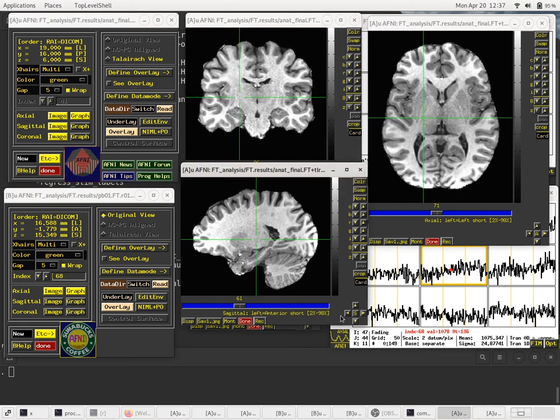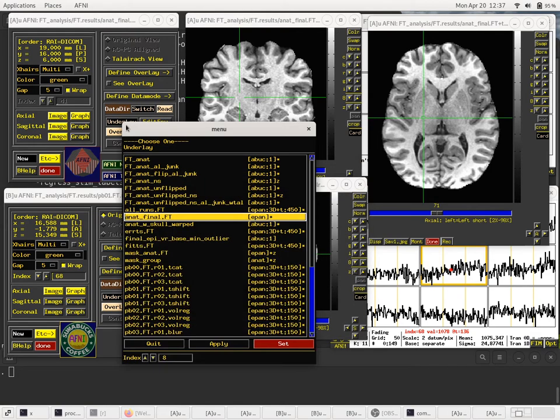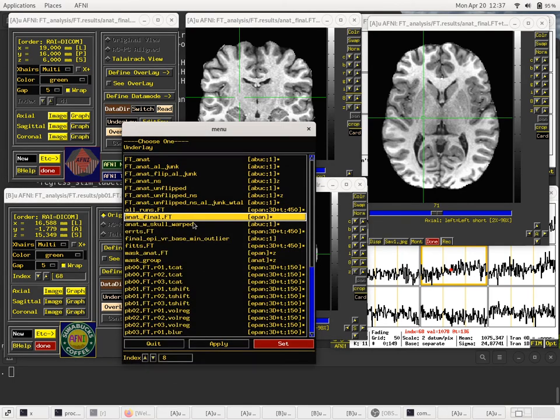Okay, so that's great. So now we've got our underlay to be the anat final, and the overlay to be the final EPI. I should have called this EPI final, but tough luck. Well, actually, final EPI is better.